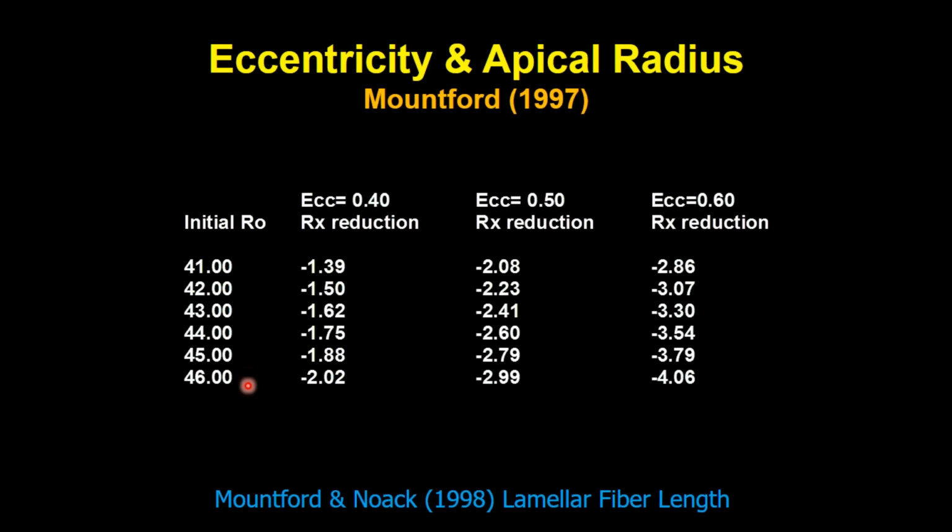The steeper the cornea, the higher the potential for Ortho-k change. So ideally, the best patient in CRT lenses is one that's both steep in radii and high in eccentricity. And the reason for that is orthokeratology sphericalizes the central cornea.